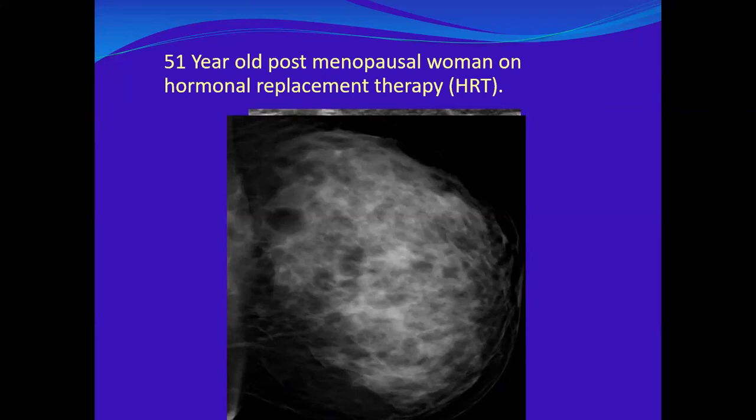Where? In the outer. This is MLO. It is CC. Yes, agree. So in the outer here, yes.